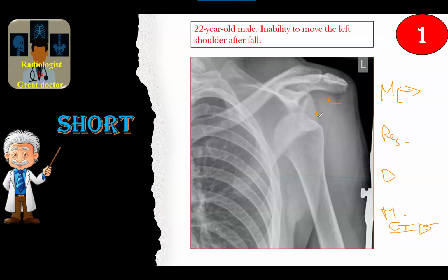You commented on this joint. Please, we have another joint. So in negatives also, no fractures. Why no fractures? No glenoid fractures. You should mention here, by the way, intact glenoid fossa, no glenoid fractures. The rest of the radiograph, normal acromioclavicular joint, normal ribs, and visualized part of the lung. Very good. Diagnosis: don't forget the side, please, left shoulder dislocation.